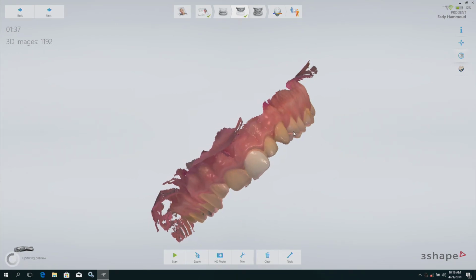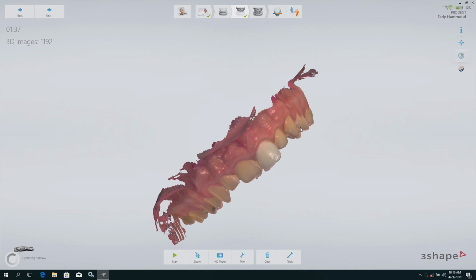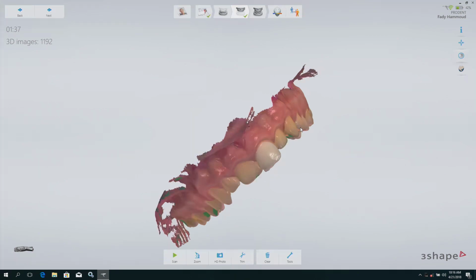The thickness will be distributed along all the teeth when the mock-up is done. It will be different thickness in different teeth. It depends on the arch. For example, on one tooth it will be 0.5 millimeter, on another almost 0. Okay, so it's mostly how much high you want the teeth to be. Yes. Okay, thank you.